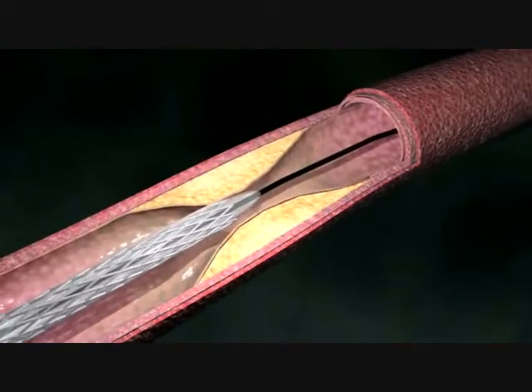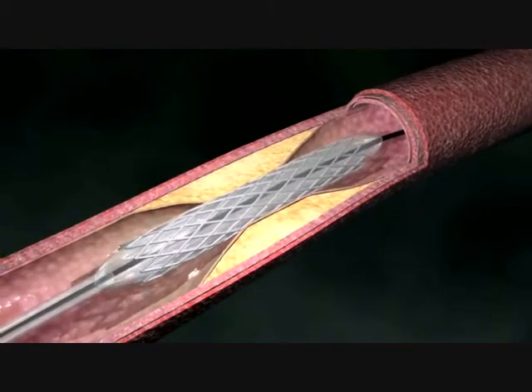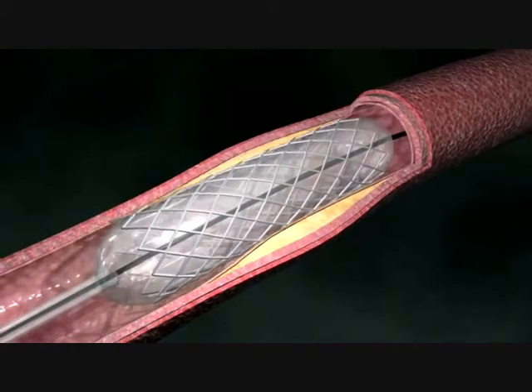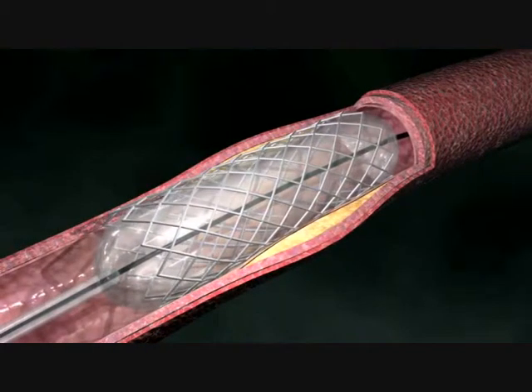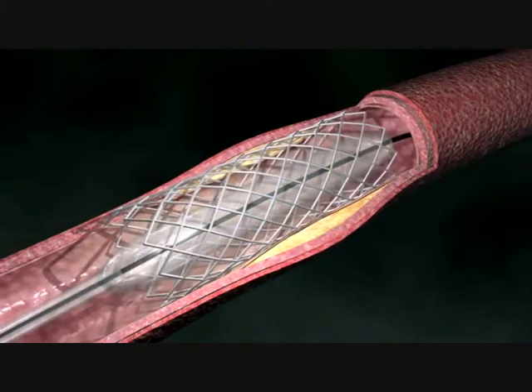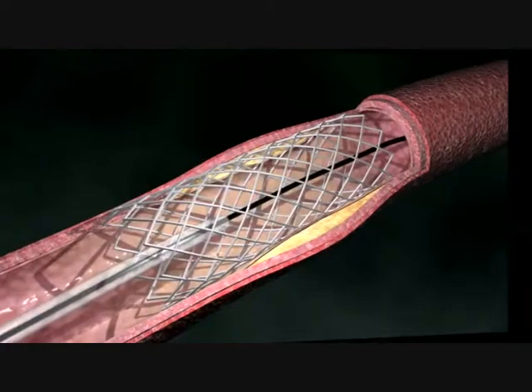Oftentimes, balloon angioplasty will involve a metal stent, which serves as a brace and keeps the artery open after the balloon is deflated and removed. The stent stays in place and the arterial wall heals around the stent with blood flow restored.